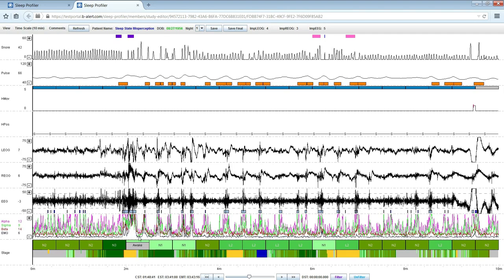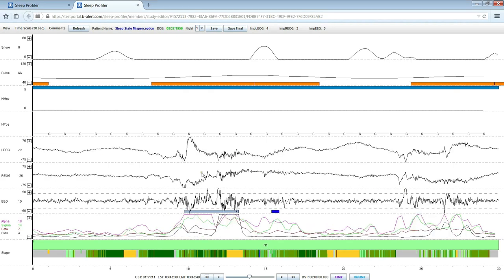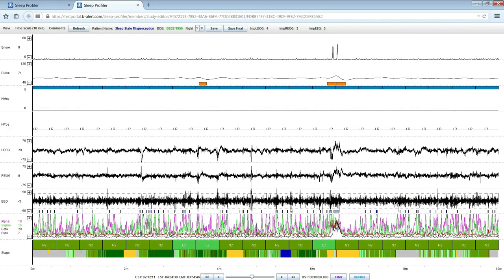After the patient awakens, you can see a distinctive pattern as they begin to transition to sleep, where there's increased EMG activity associated with breathing instability. So I'm going to left click, and you can see the arousals here and the arousal here, and I'm going to leave those stages as they are. We have now finished editing the first 4 hours of the record.